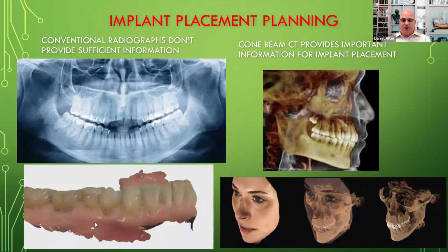What's really cool is now, with the integration of different scans and different technologies, we can incorporate even the patient's face. And, as you see here, there are face scanners, you can do it in 2D, and there are some examples I'll show you throughout this presentation, where you're incorporating the patient's face and the changes happen automatically. And there are even some AI platforms that allow for videos of the patient speaking. And while the patient's speaking, your restoration or your proposed restoration is going to be virtually placed into that. So what does that do?